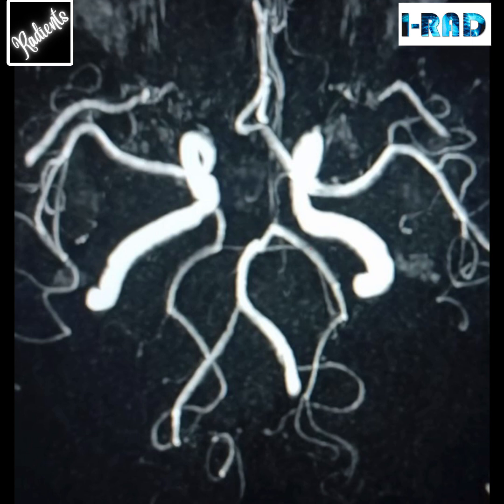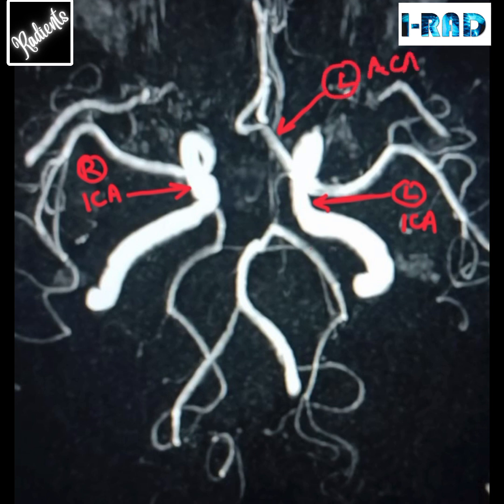So if we look here, this structure here is the ICA. So this is the right ICA. This is the left ICA. And these are the terminal branches. So this one is the left ACA, and this is the left MCA.